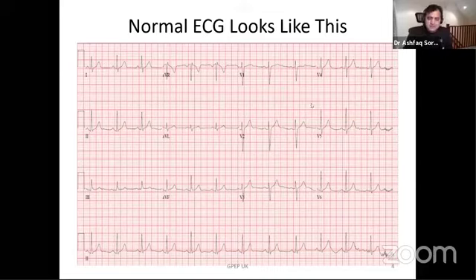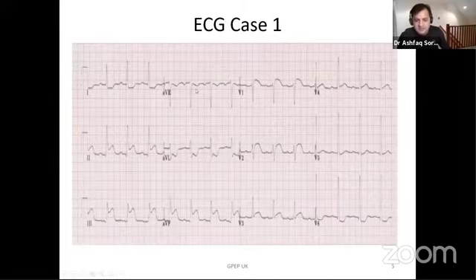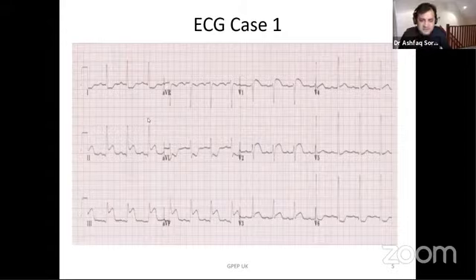So let's talk about the first case. Let's see what this ECG shows. Those who have attended, I'm sure all of you have attended and participated. So anyone who knows what's going on in this slide, what's wrong with this ECG? I want a quick answer because we are going live, so I can share my thoughts quickly.